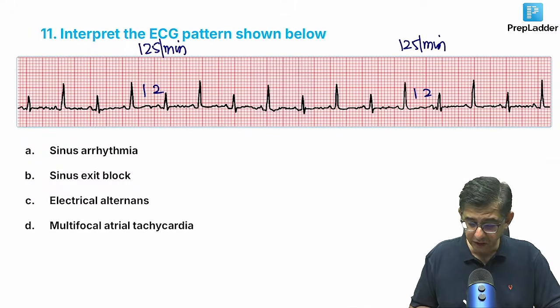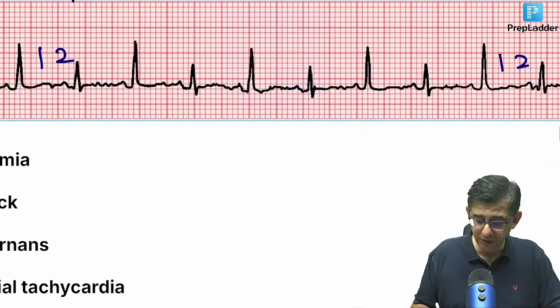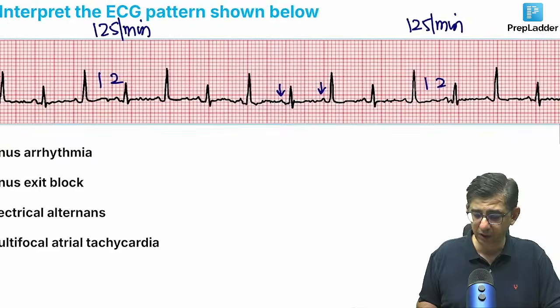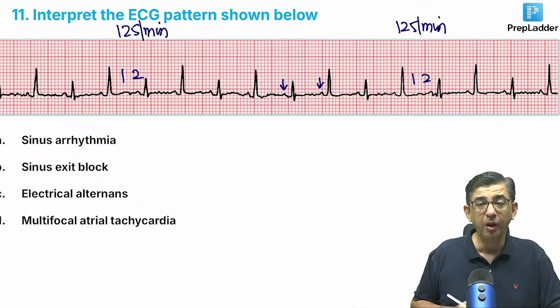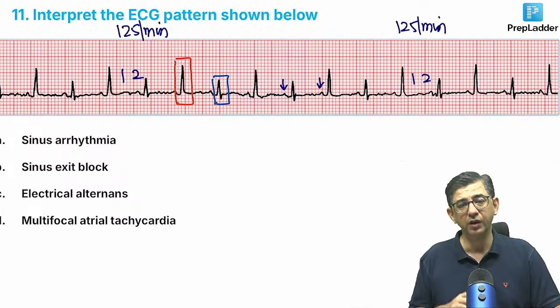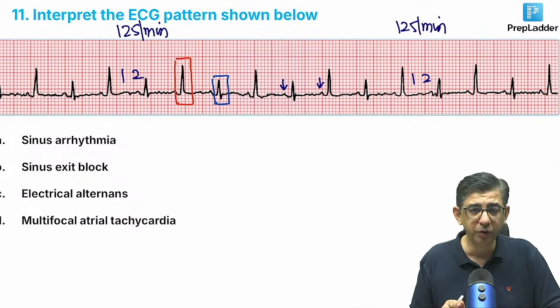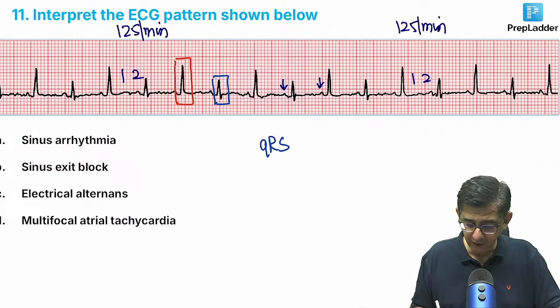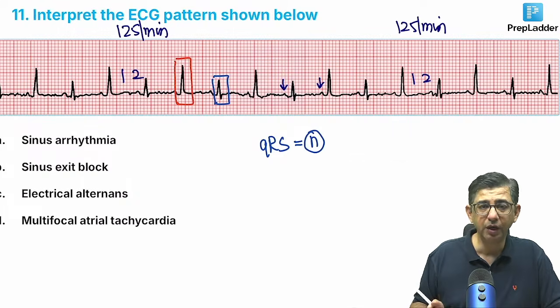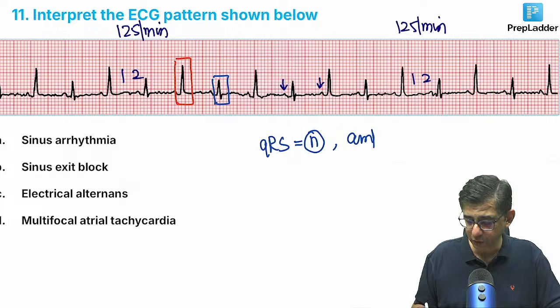So this initially मुझे लगा कि यार ये जो twitching सी लग रही है, this could be like a atrial fibrillation, but P wave is very much discernible. I mean the P wave is discernible, and in atrial fibrillation the RR interval should be changing. यहाँ पे तो जैसे RR interval देखते हो left to right, it is still the same, but the main thing is the height of the R wave. The height of the R wave is what I think most guys have been able to pick up here, the QRS complexes. The height is changing of the normal duration QRS. जैसे पॉलीमॉर्फिक वेंट्रिकुलर टैकीकार्डिया में जो क्यूआरएस होता है उसकी ड्यूरेशन ब्रॉड होती है और हाइट चेंज होती है. यहाँ पे क्यूआरएस की ड्यूरेशन नॉर्मल है, लेकिन एम्पलीट्यूड जो है वो वेरिएबल है.